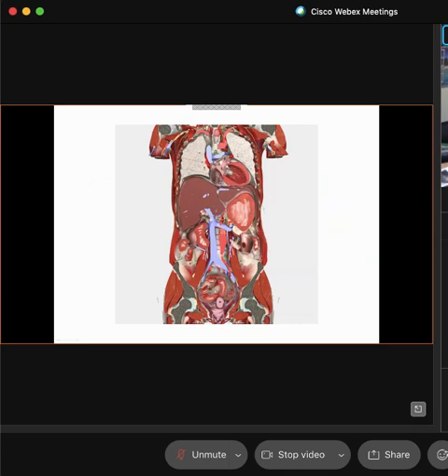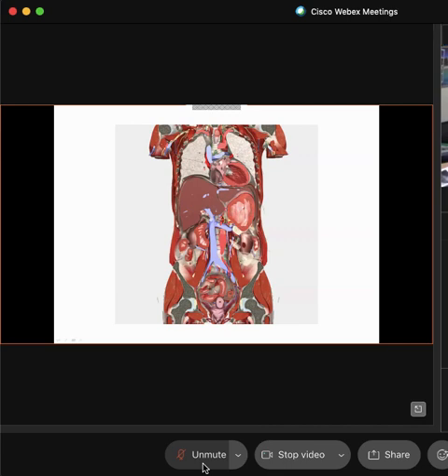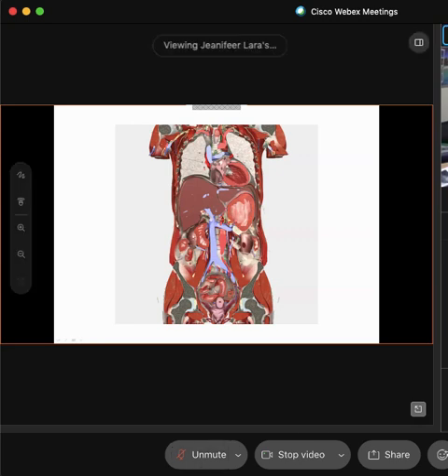Okay, so when we're taking a look at this, this is a color view of what kind of projection, Jaleisha? Coronal view? Coronal. Good, Justly. Now, we know that this is the liver. What would this be? The stomach? Very good. Did you say the stomach? Okay, good. But I think someone answered for you, Justly, so I'm going to go back. What is this right here?